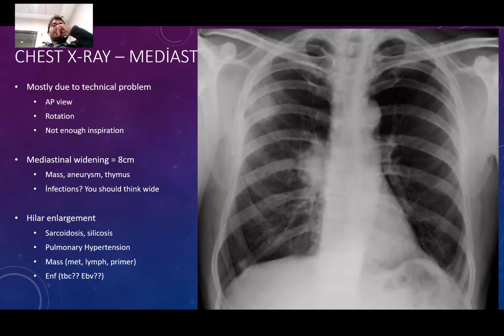Can you see the abnormality in this patient? I'm seeing the right hilum big, obviously. I can see that. Also, I'm seeing some mass lesion on the right upper lobe, right? Some very round lesion on the upper side. So if I connect these all together, it's probably some lung mass which has lymph node metastasis. Okay.